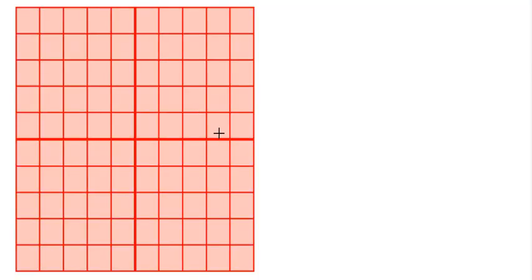Now let's learn about some ECG measurements. Let's suppose this is a piece of ECG paper, and this is the x-axis, this is the y-axis.